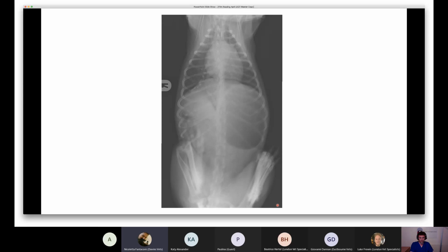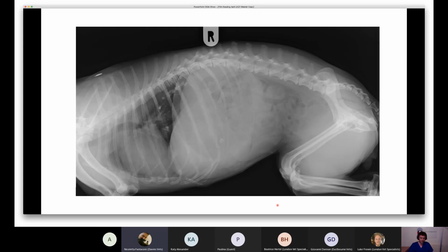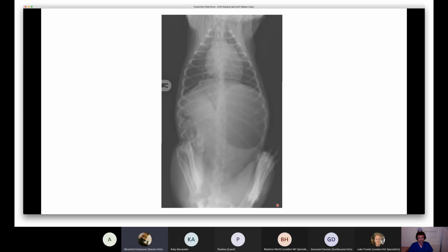It's really difficult to see if these structures follow the bronchial tree, or are at the end of it. I wasn't really sure when I had a look at the X-rays, to be honest. Probably they follow the bronchial tree, or if not, they are in the alveolar part of the pulmonary parenchyma, but I'm not sure about it.